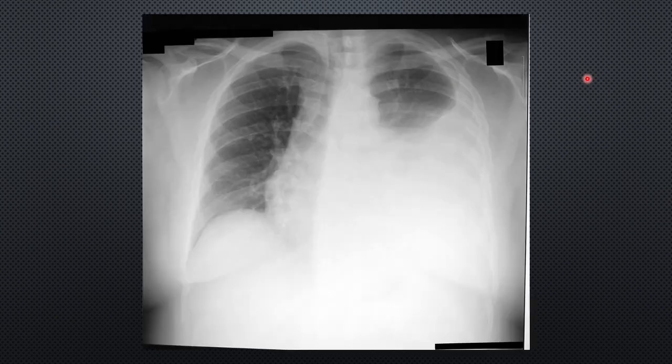Second one here. Please pause your video now. Okay, so in this plain film we have on this side here a pleural effusion, with the trachea actually being pushed to the right side, if you can see. So if this is here the trachea, and it's coming down and going off to this side. And this here is your pleural effusion with the meniscus tracking up here on the side wall. Good.